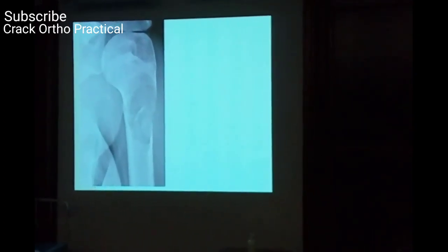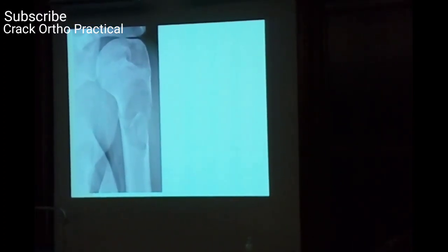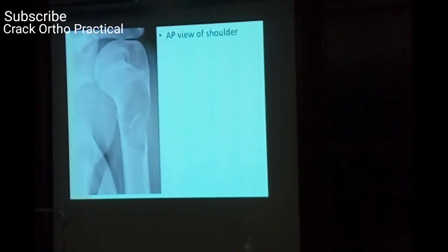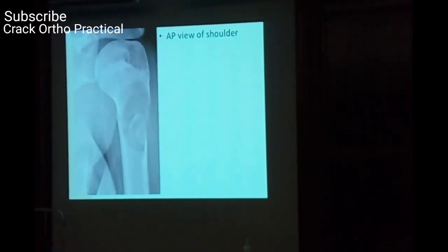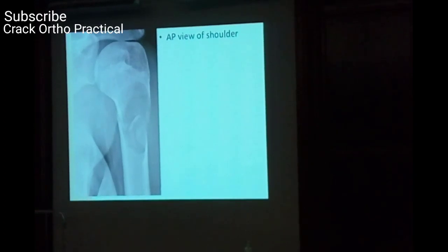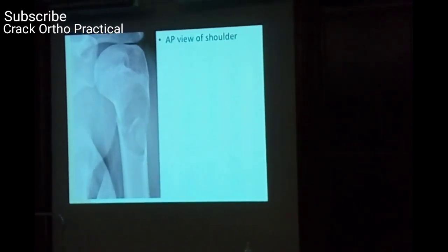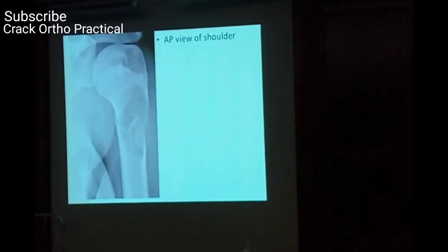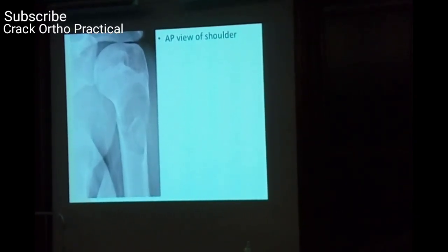X-ray, right proximal humerus. The X-ray shows the proximal humerus in a skeletally immature person, AP view. It's a lytic lesion in the metaphyseal region of the humerus with a cortical break. The fallen fragment sign is positive, without any periosteal reaction.